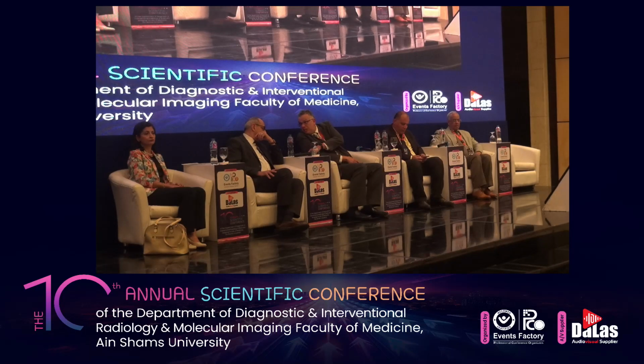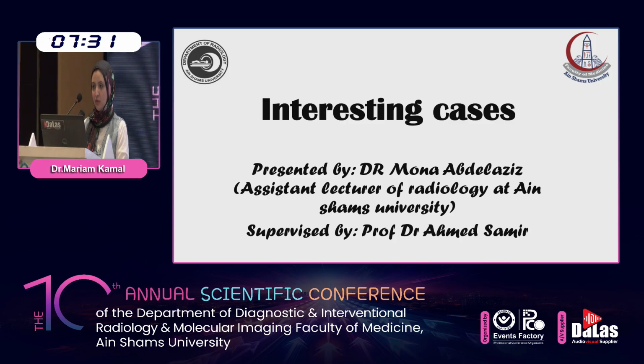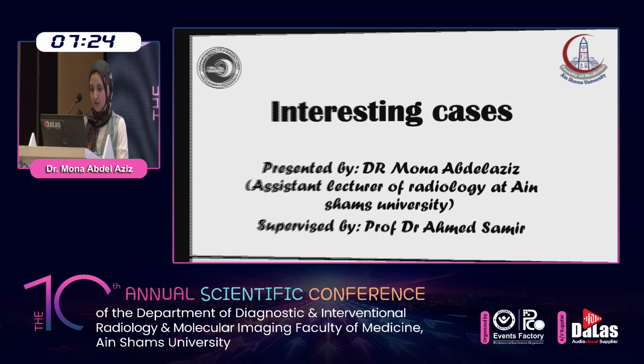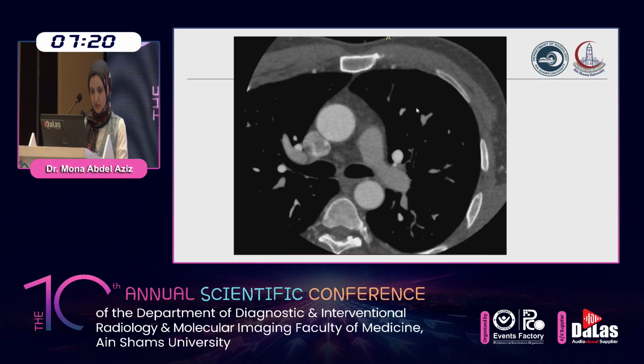Dear professors and colleagues, now I would like to share with you two of our interesting coronary cases, and we'll discuss together their imaging features and the key points that we can learn from each case. First, we'll see the case, and then we'll discuss the findings together.